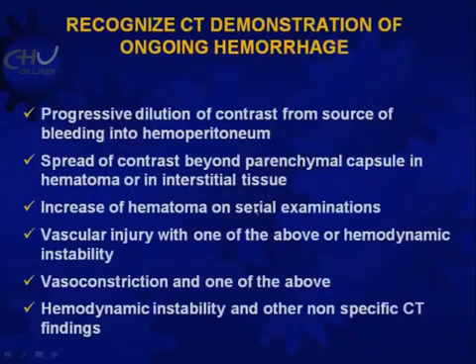By progressive dilution of contrast in the hemoperitoneum, spread of contrast beyond the capsule of an organ, increase of hematoma on different scans, or a vascular injury, or vasoconstriction and one of the above, or hemodynamic instability and one of the above. And this is a nice example of how far you have to go to see extravasation.